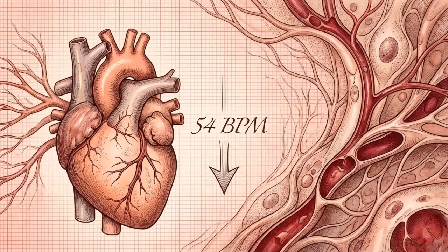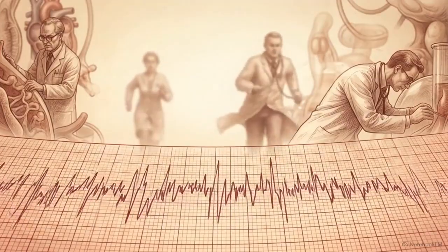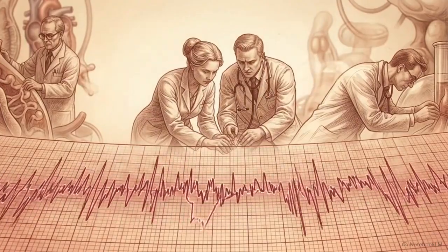These calculations set your physiological boundaries. A rate falling below 60 beats per minute indicates bradycardia, while a rate rising above 100 signifies tachycardia. Establishing this baseline rate and rhythm dictates your entire context. It reveals whether the heart is in a sustainable state or facing an immediate crisis.